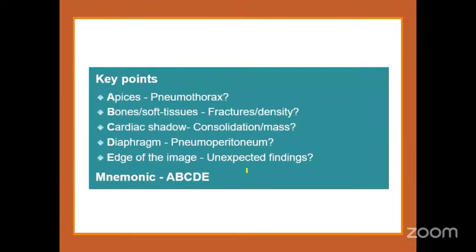So I think the routine common findings in an X-ray, like identifying pneumonia, identifying pleural effusions, identifying pneumothorax, identifying if the patient has COPD, I think I have roughly shown you adequate images.